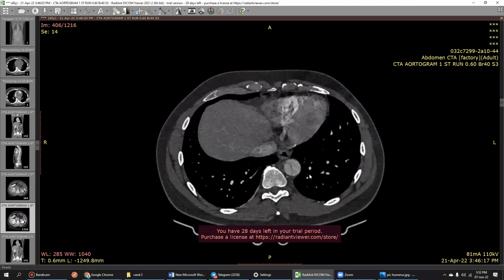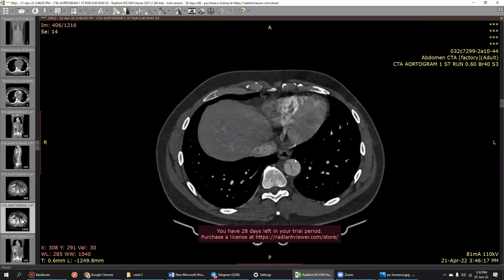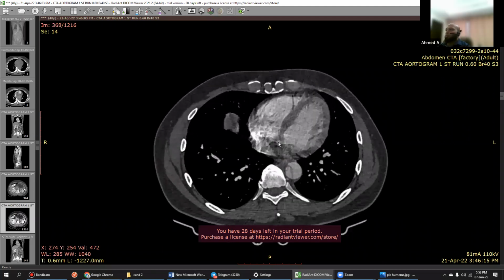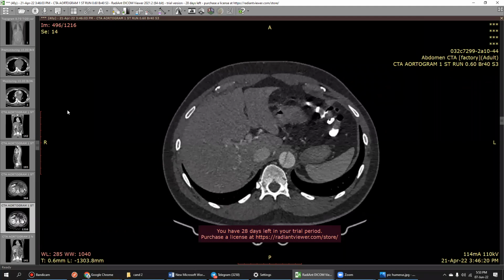Size of what? Aorta. Aortic size, because if it is an aortic dissection with aneurysmal dilatation, that is very much urgent. This is urgent, but that is more impending perforation. No signs of impending perforation, that was what you have to mention to get more marks. What you have done is good. That's not like you have done anything wrong.